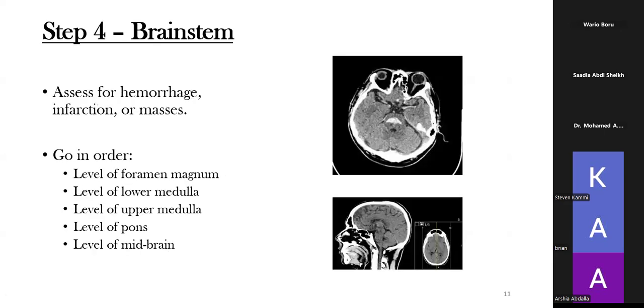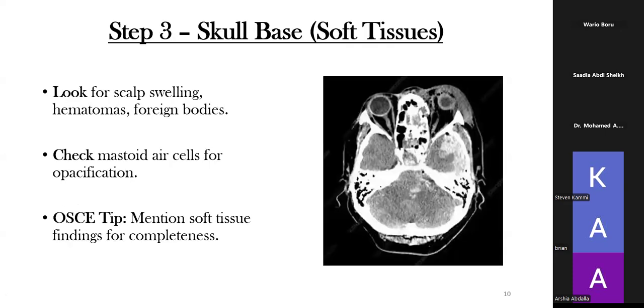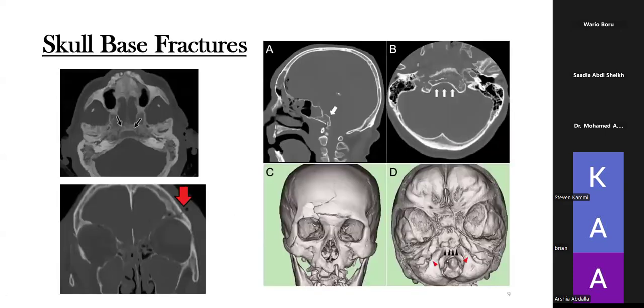Now, next, after we are done with the skull base, sorry, I wanted to mention here, it's extremely key. This one is called the foramen magnum. At the level of the foramen magnum, you will see, is there crowding? Is there no crowding? Crowding means that there is almost herniation occurring at that level. And your thinking behind it is, is there something upstream that is pushing something downwards?